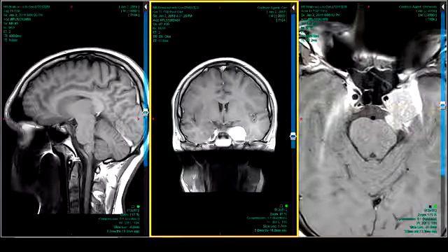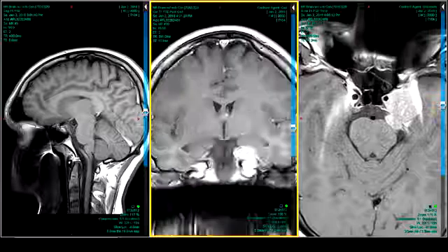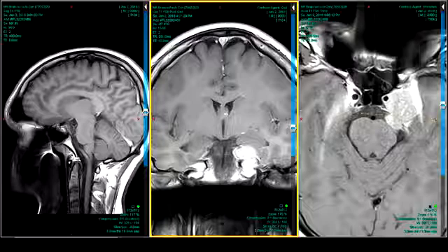The relation to the carotid is going to be important to the approach taken. And the relation to the sylvian fissure is going to determine whether you can peel back and dig it out, or whether you have to go this way. You have to give some thought to that. But the fact that it has posterior fossa extension is probably what's going to make it require surgical treatment at some point. Meaning, if this got twice as big... I don't know what they'll end up doing, because you're not going to fix his sixth nerve palsy by taking this out, probably.